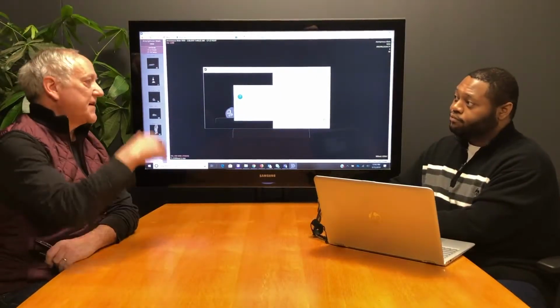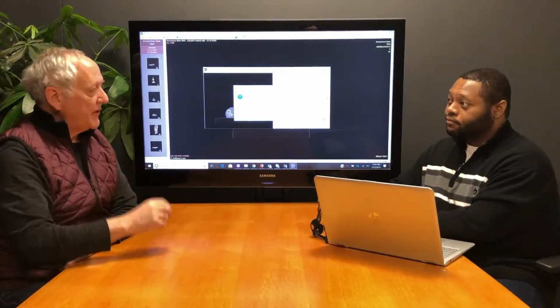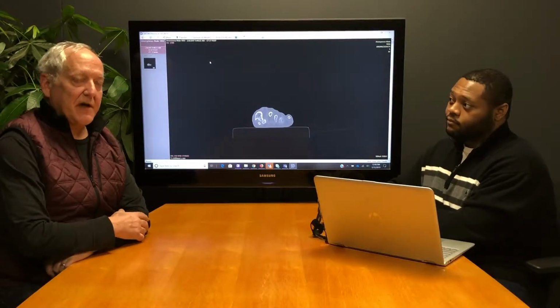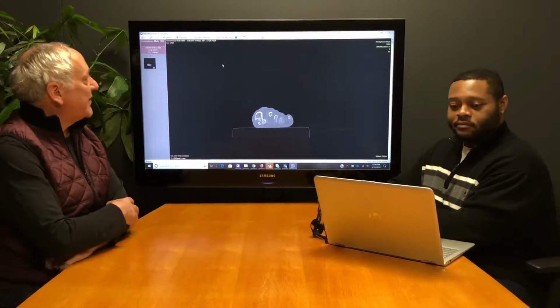Okay, great. So that's going to send it up to the cloud, and it's from there that we can make the model. Yes. Okay, so now we have our study uploaded onto the PAC server in the cloud, and from there we can order the model, correct? Yes. Go ahead and walk us through that.